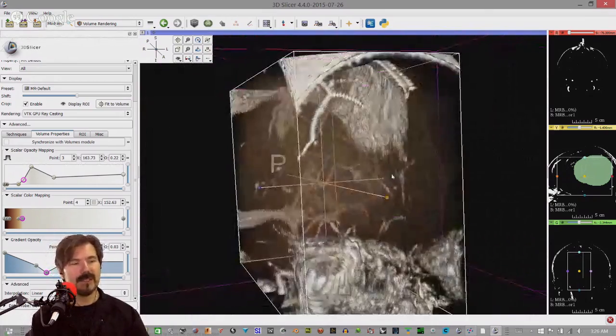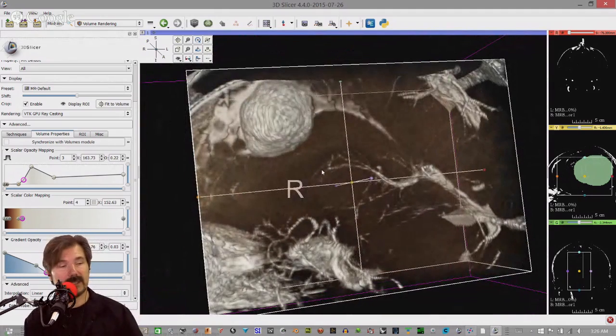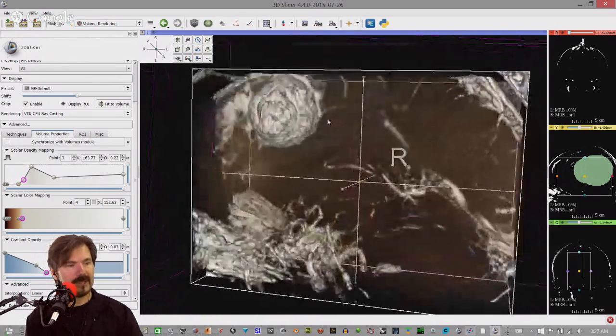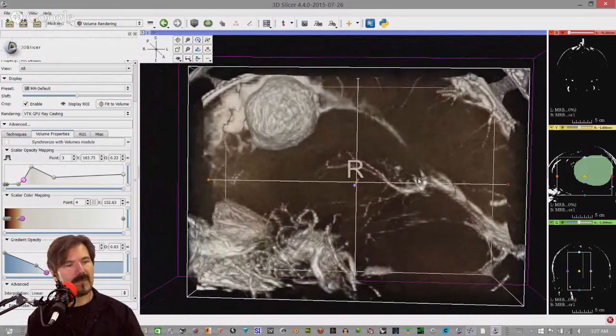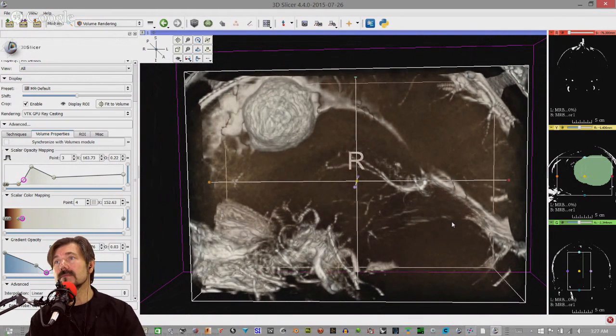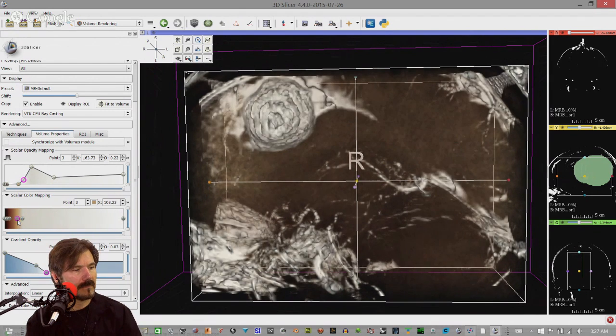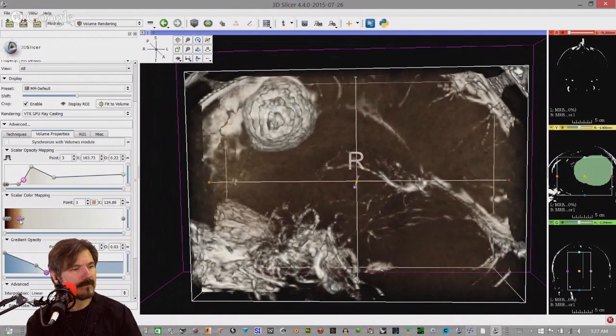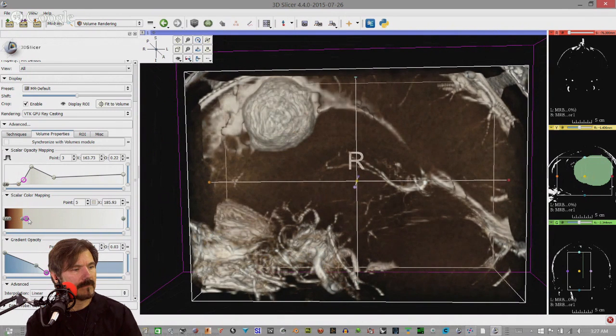So what would that tell you? I don't know where they got this particular MRI sample from, but as a radiologist. Yeah, well, I'm trying to look at what you're playing around with, and it looks like it's the opacity, right? It's opacity mapping. That's a scalar opacity mapping that's already been keyed to a particular color. Yeah, so I wonder if it's highlighting the properties of the tumor and everything you're seeing there. This is what I'm guessing in terms of what this function is doing: if it's restricting it to a certain characteristic that it's looking for, then it's interesting.